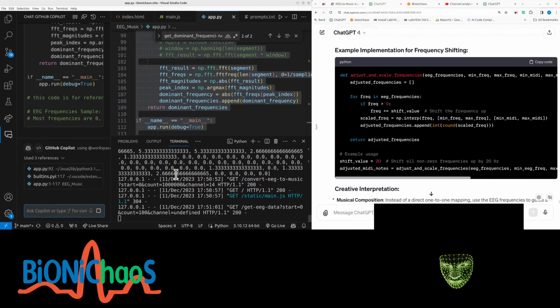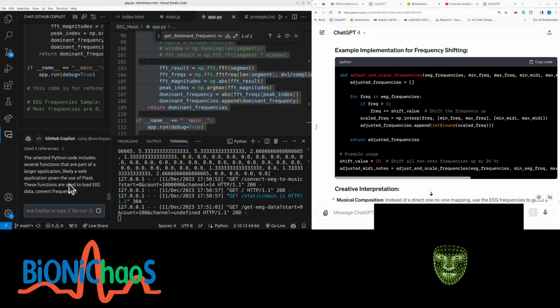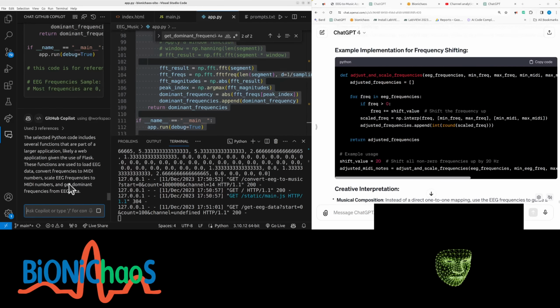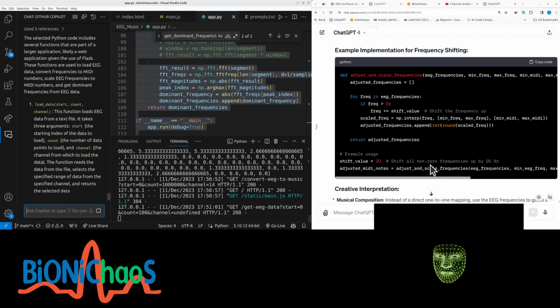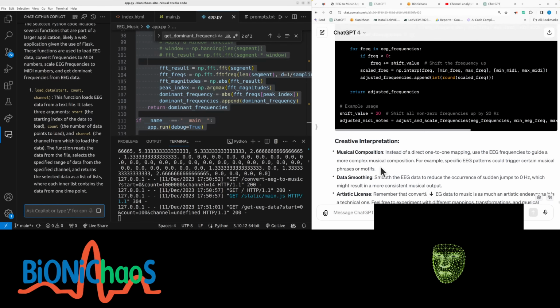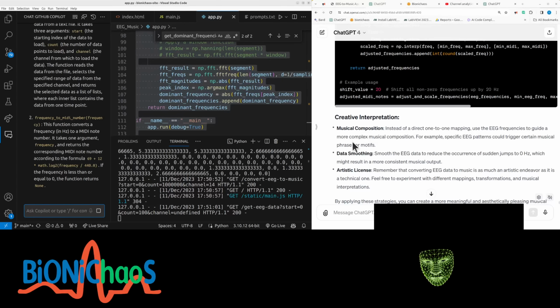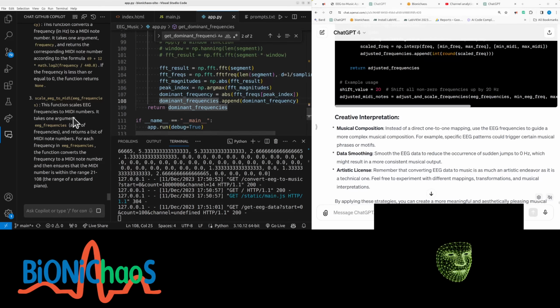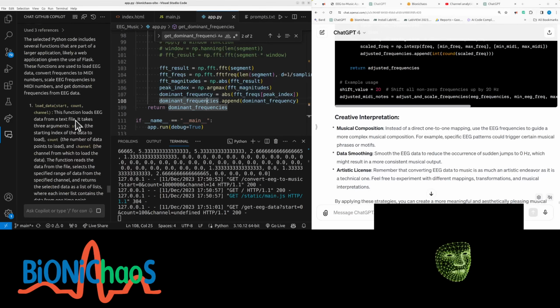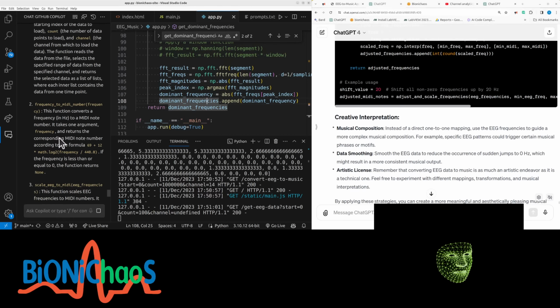We're still on the EEG to music conversion generator. It works, but it sounds horrible, as expected. So try to improve it by doing frequency shifting or some fancier interpolation. So we had a linear interpolation in the code, but I don't see it anymore. Somehow disappeared.